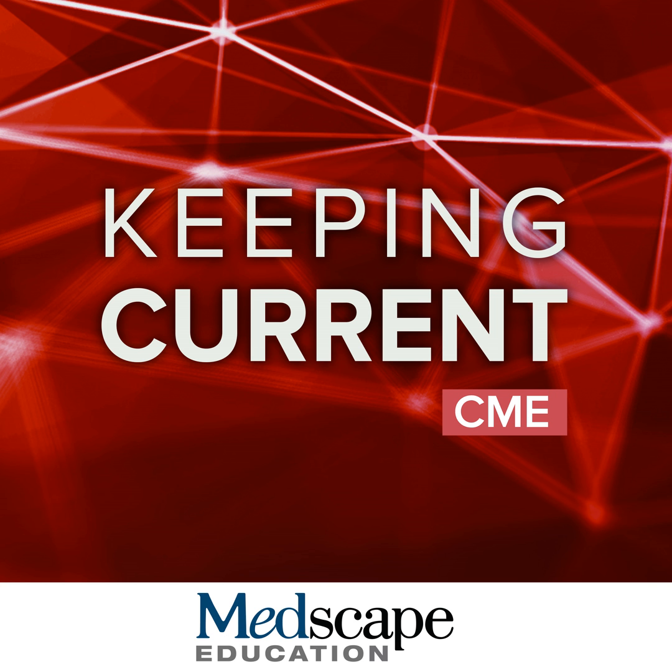So this is what the single shot acquisition looks like. We acquire multiple images. The entire image is acquired in one heartbeat, but it allows us to image the entire heart in a single acquisition. It can be carried out free breathing. It is insensitive to arrhythmia. It does allow you to cover the entire heart. However, it is generally lower in resolution because you're acquiring the images far more rapidly.